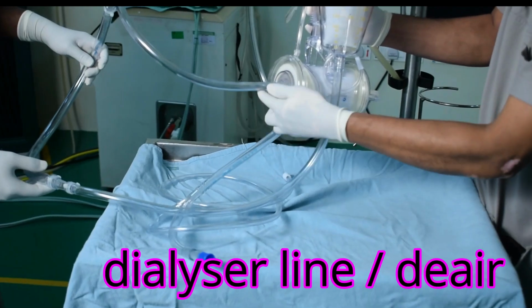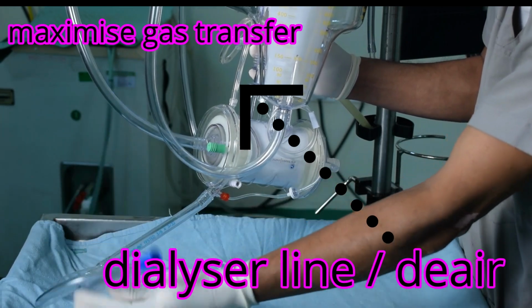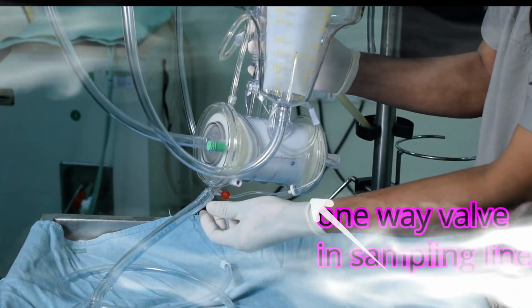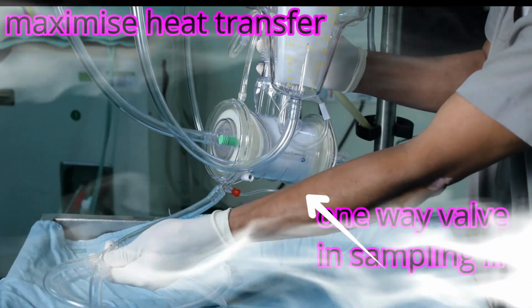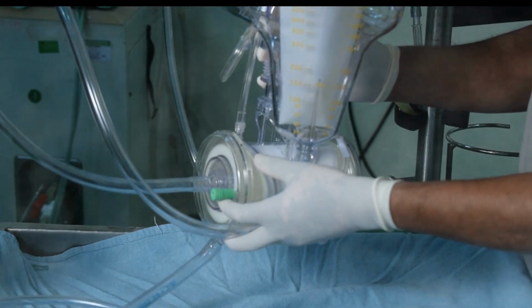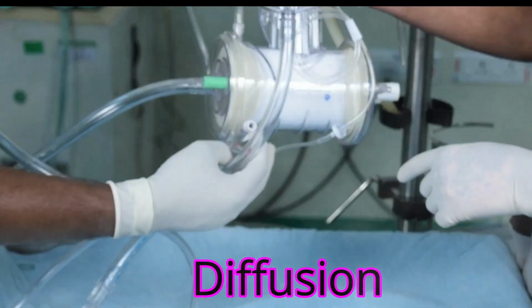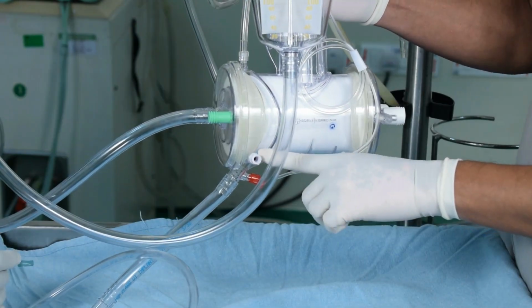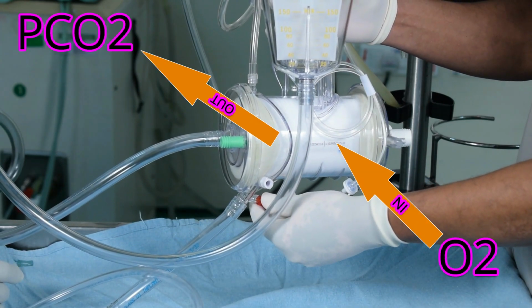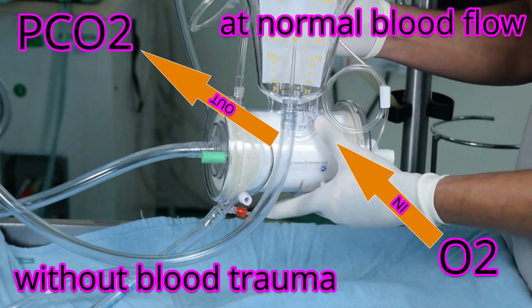These oxygenators are designed in a way that the amount of oxygen, carbon dioxide and other gases that can be transferred at a given blood flow rate is maximized, to make gas transport easy to regulate, to maximize heat transfer efficiency, to minimize blood trauma and to minimize the priming volume. Now, gas transfer from the gas to the liquid phase or from the liquid to the gas phase is driven by diffusion and is based on the partial pressure difference of a particular gas. The ideal oxygenator would transfer oxygen into and remove carbon dioxide from the blood at physiologic blood flow rates with very minimal trauma to the blood and with a very small priming volume.